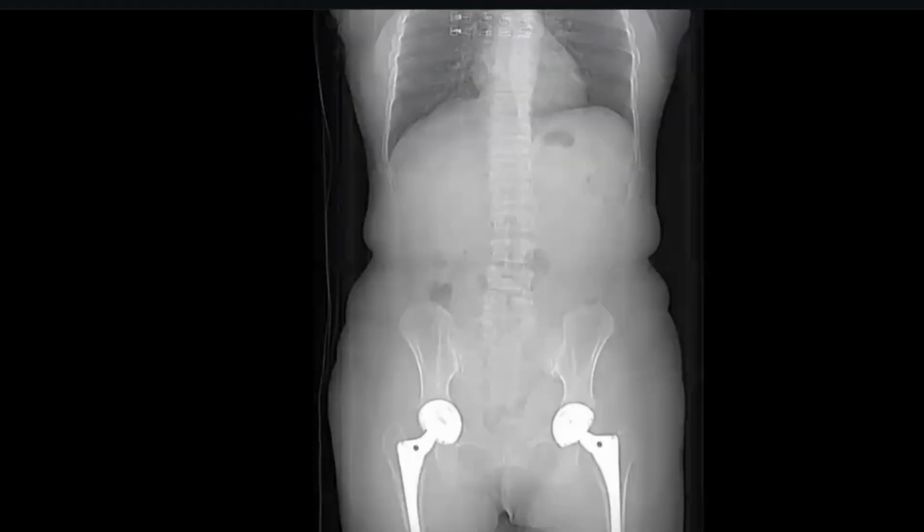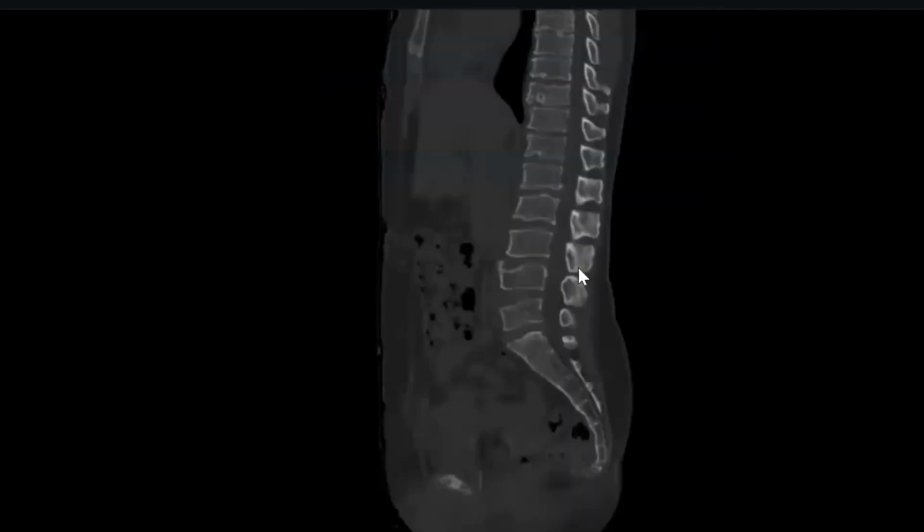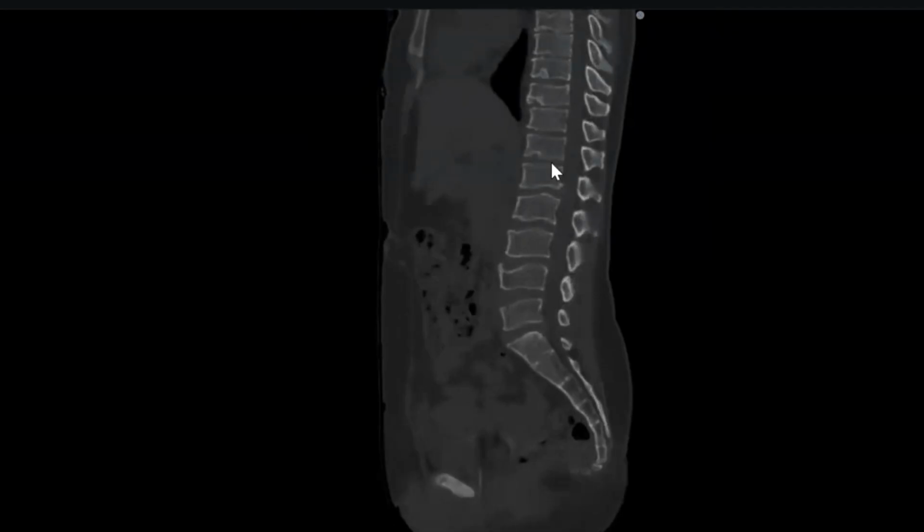Thank you, doctor, so much. They have bilateral replacement of the hip. This vertebra looks like there is some abnormality and irregularity. Our candidate asked for a lateral view. This is not normal at all: all the end plates look like Scheuermann syndrome.